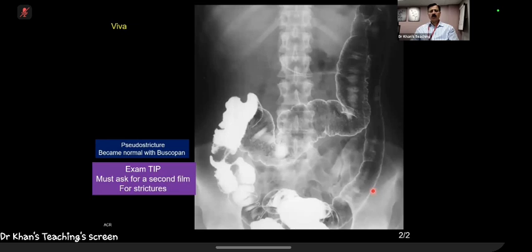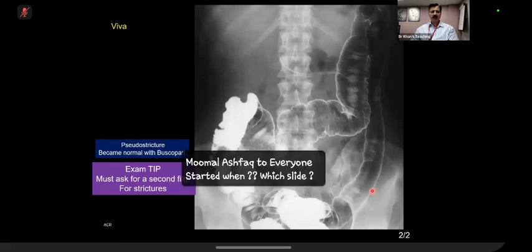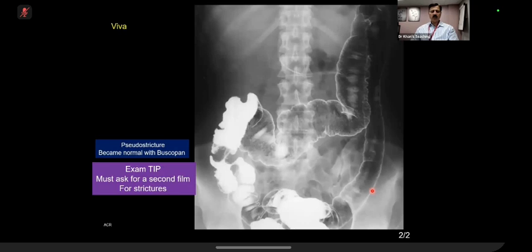Now, transmural versus superficial, and this helps you make the radiology. Deep ulcers will be seen in Crohn's disease. On the other hand, in ulcerative colitis, it will be quite superficial. There will be no fistulae in ulcerative colitis. There will be fistulae in Crohn's disease. Skip lesions are Crohn's disease. Ulcerative colitis will be a continuous disease.